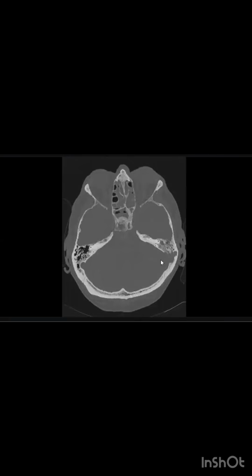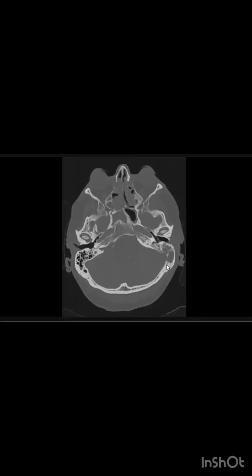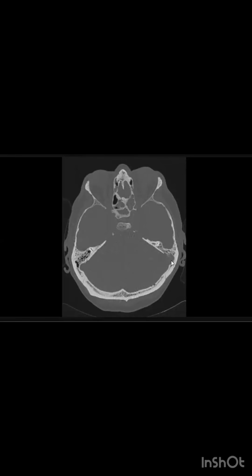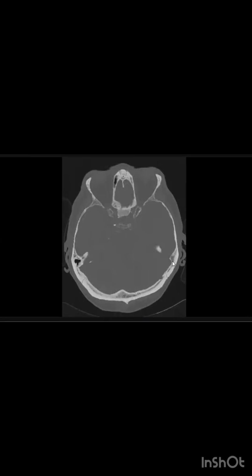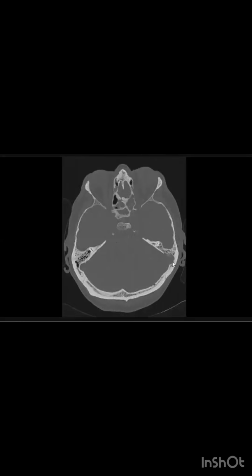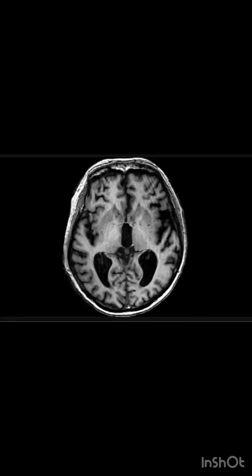So on the bone window, I can see that there is some bony erosion noted along the mastoid antrum. These could represent an infectious process extending into the subdural collection formations. We did an MRI. I will give you diffusion.